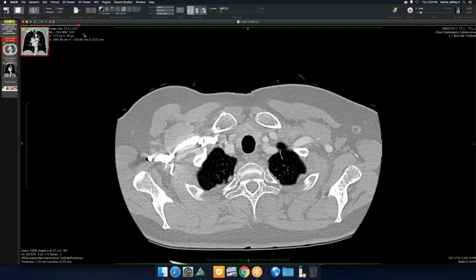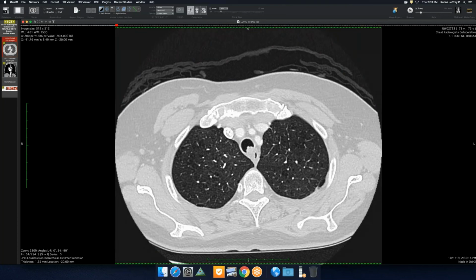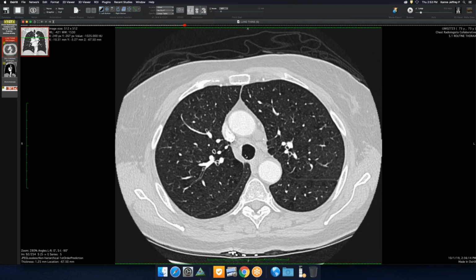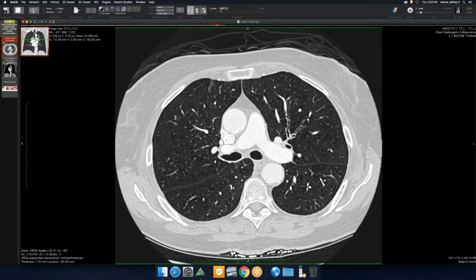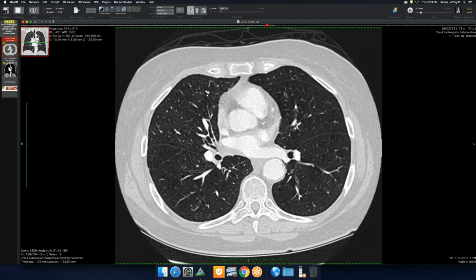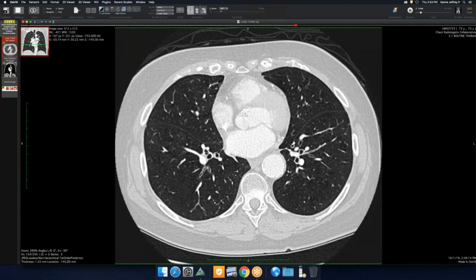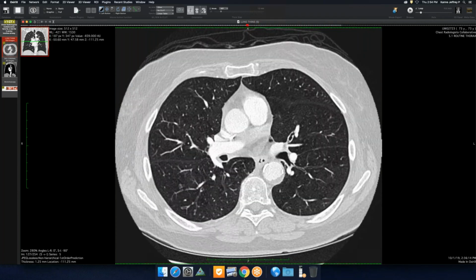And she has these nice filling defects in her trachea. She's a former smoker and just has all these blobs in the trachea here. So, a nice example of tracheobronchial papillomatosis. She does not have lung involvement, probably a little bit of microaspiration down there at some point, or just from obstruction. Does not have any squamous cell cancers at this point.